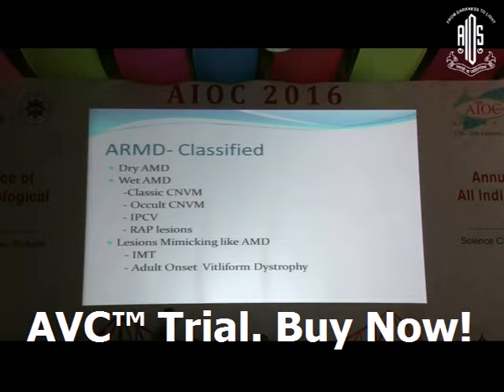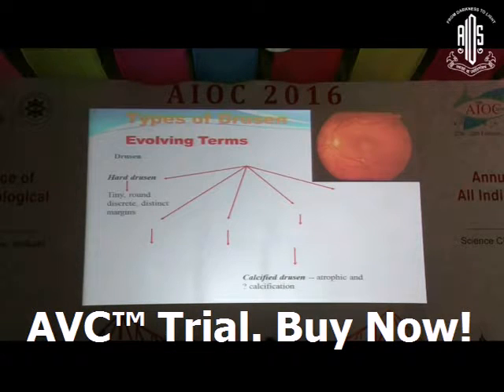Age-related macular degeneration is basically classified into dry AMD and wet age-related macular degeneration. Wet is divided into classic CNV and occult CNV. There are variants of CNVM that we call IPCV and RAP lesions. Then there are certain lesions which mimic age-related macular degeneration, that is IMT and adult onset vitelliform dystrophy. So in this talk, I'll be talking about the fluorescein angiography features of all these diseases.